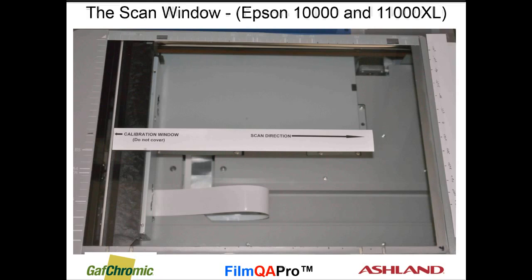Films are placed on the glass window in the scanner base, but avoid placing anything on the 1 to 2 centimeter area at the left of the window, as this is where the scanner calibrates the light source to set the upper end of the 16-bit range. And keep the glass clean. A glass cleaner spray is ideal for this purpose, but don't forget to clean the glass in the cover.